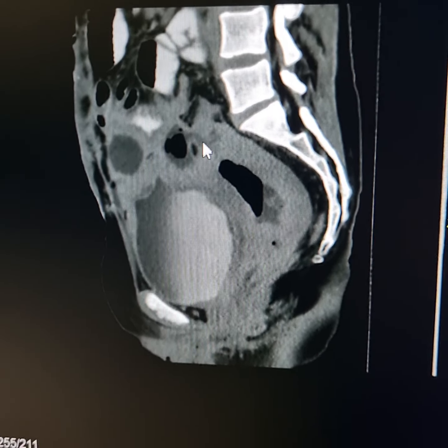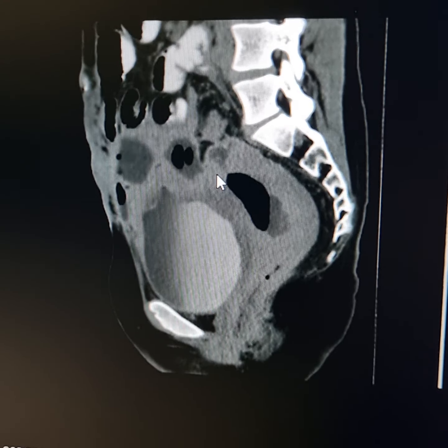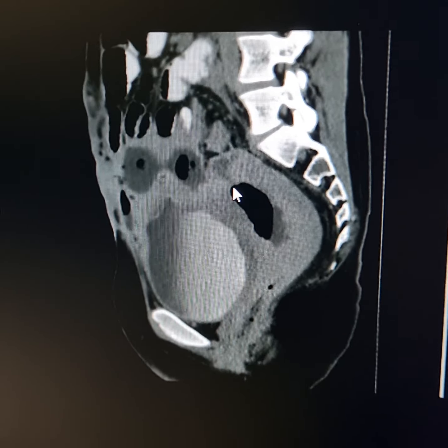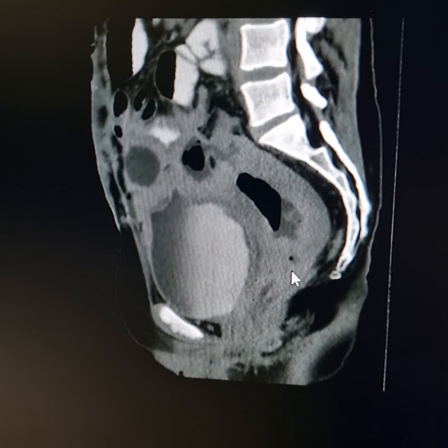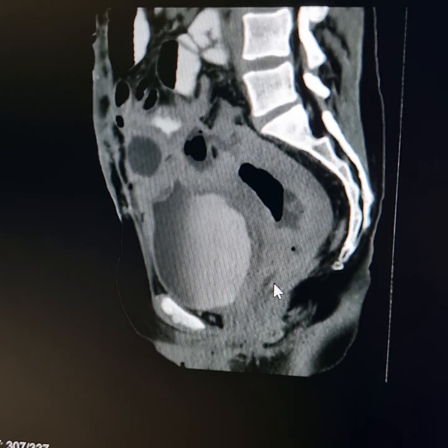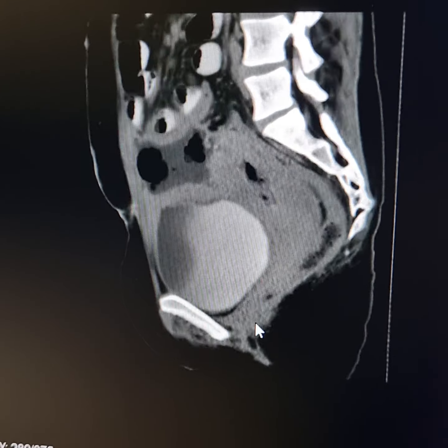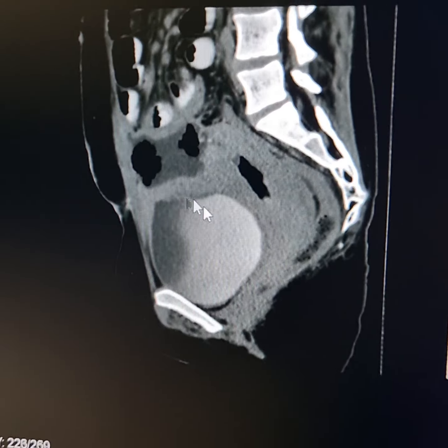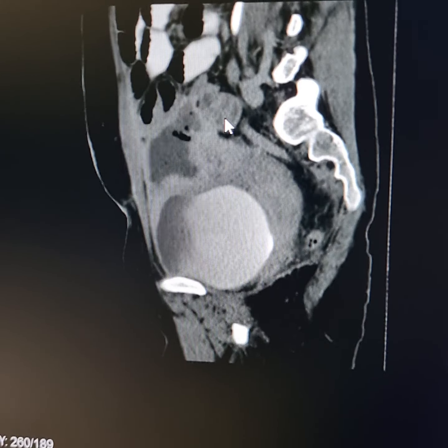Uterine cavity. This is the site of communication through the residual fundus. This one here, a thin streak like this one. Air-fluid level, and this is the vaginal streak extending downwards. Abscess here. This is the left ovary. This one is the residual left ovary.